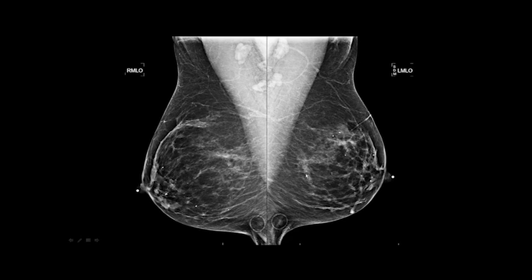Now here's very, very beautiful MLO views. You can see superiorly there's wide muscle with the convex border all the way down to your PNL line, your posterior nipple line. If you draw a line straight back from the nipple, you can see its posterior nipple line. It's beautiful. Very wide superiorly. They're looking for that convex border with the muscle pattern to show that the patient was leaned in and down. The nipples are perfectly in profile.